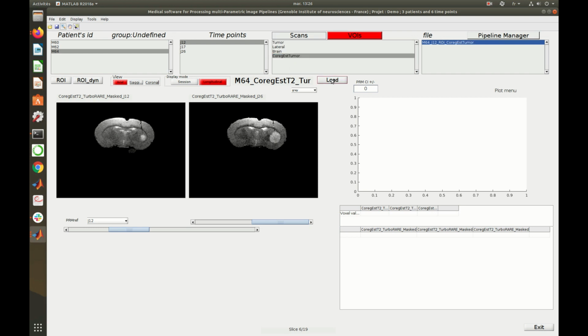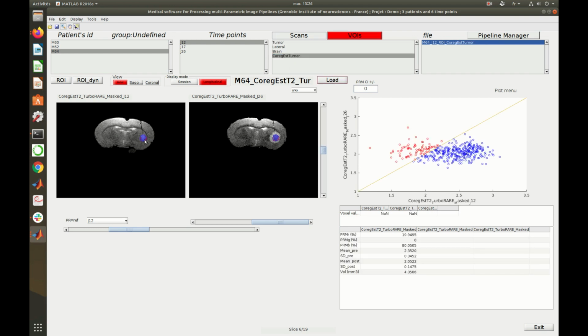Since I applied the computed transformation on the region of interest representing the tumor, one can open those files on the registered scans and display a parametric response map analysis that gives us graphical information about the evolution of the selected voxels through time.